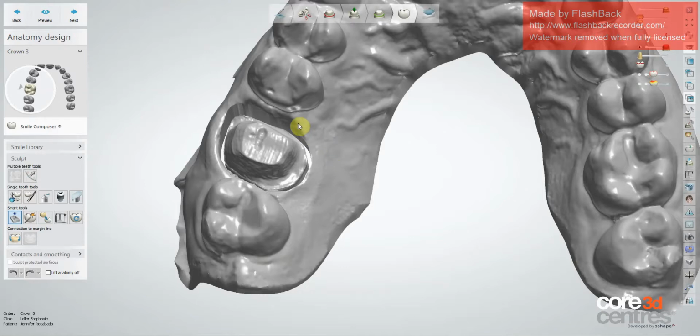Today I'm going to walk you through really quickly a video on how I use a library that I've come up with and the philosophy behind my design philosophy. My design philosophy is very simple.